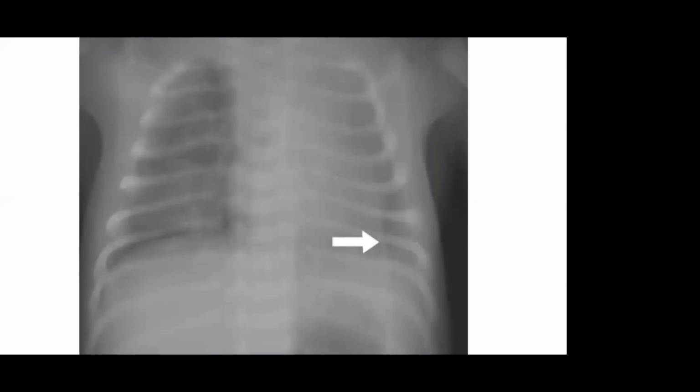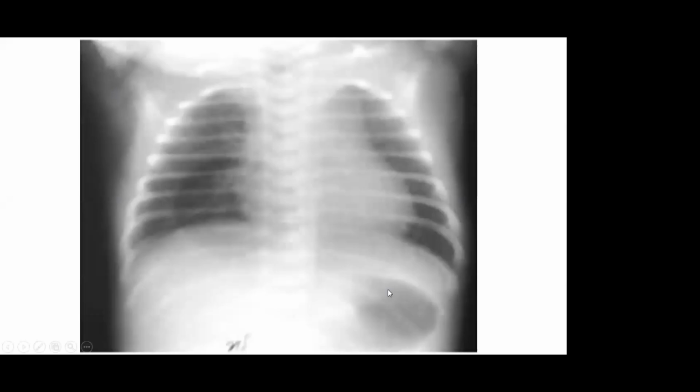This is a skin fold. If you see, any pneumothorax will not go beyond the lung margin. You can see it is going into the abdomen also. This is more of a skin fold.